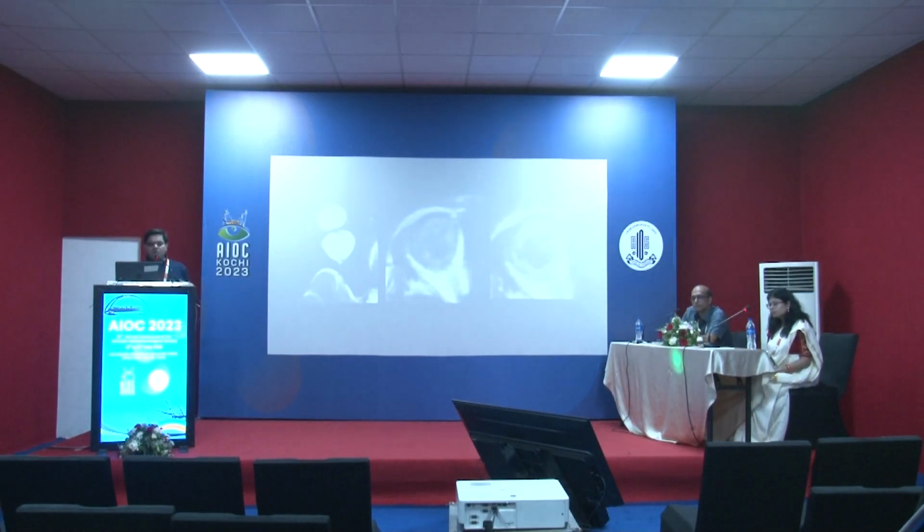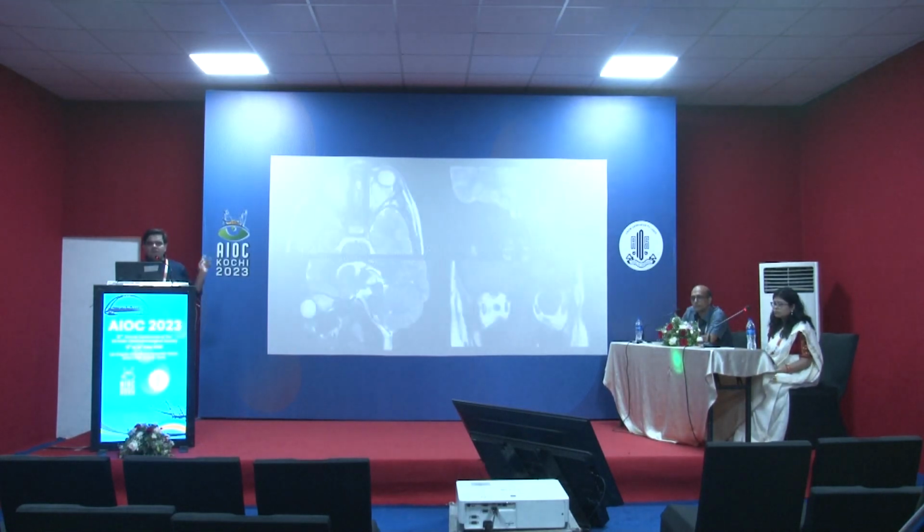This is another lesion which looks similar, but look at the enhancement pattern. In the early phase, it had a broad area of enhancement, very unlike a hemangioma, and this was a schwannoma. So dynamic contrast enhancement is very important for cavernous hemangiomas.